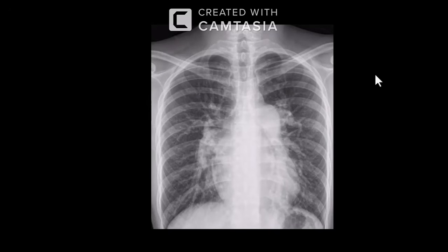In the aortopulmonary window, there is an opacity tapering towards the lower aspect, giving the appearance of an enlarged pulmonary artery. I can also see prominent bilateral bronchovascular markings along with peripheral pruning.